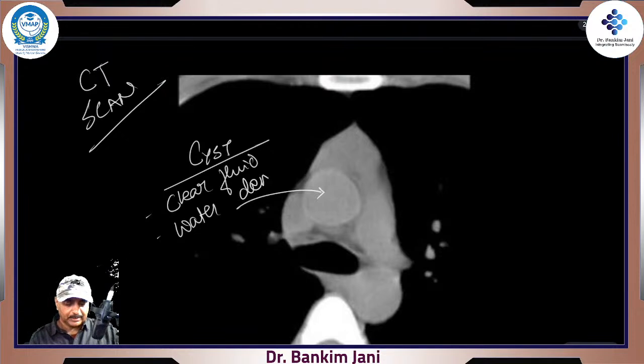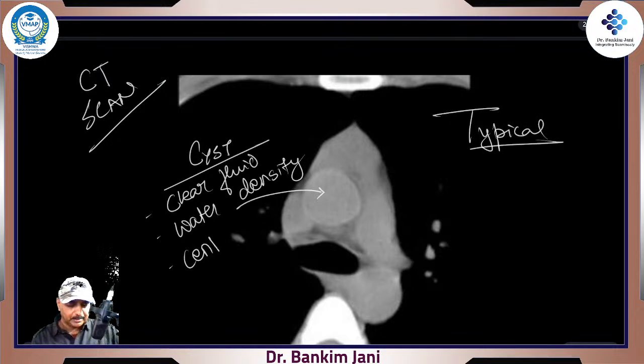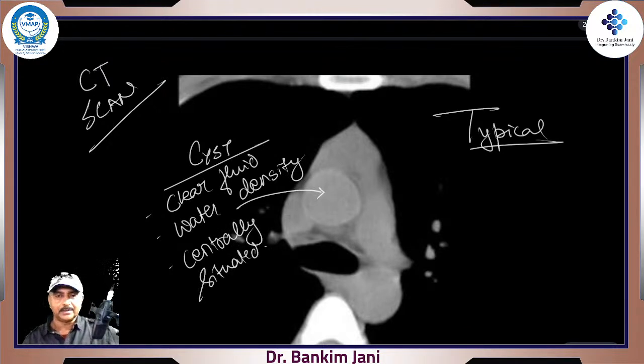It is centrally situated. No doubt about it. This is a typical thymic cyst.